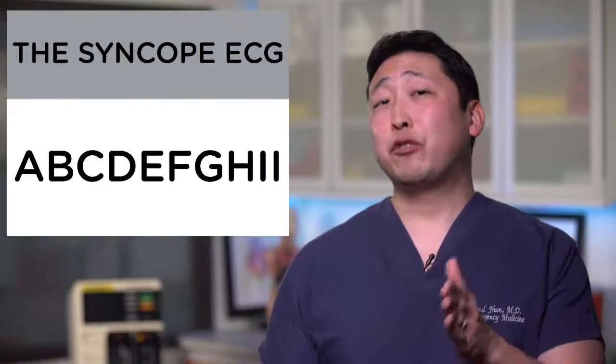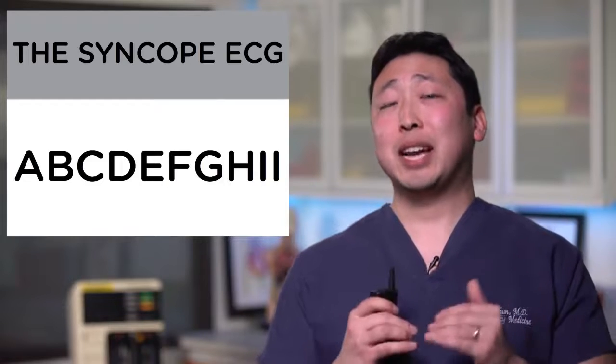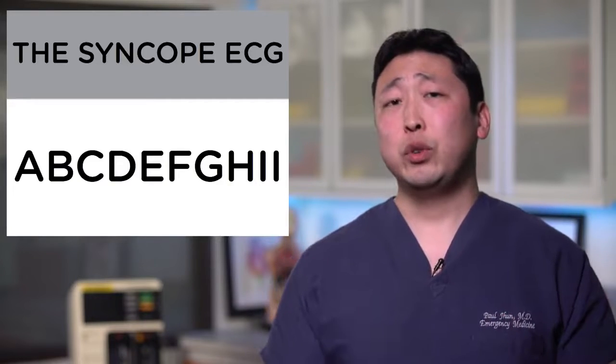Moving on to B. B is for Brugada syndrome. You're looking for the classic coved type or saddleback type morphology with ST elevation in at least one lead in V1 through V3.